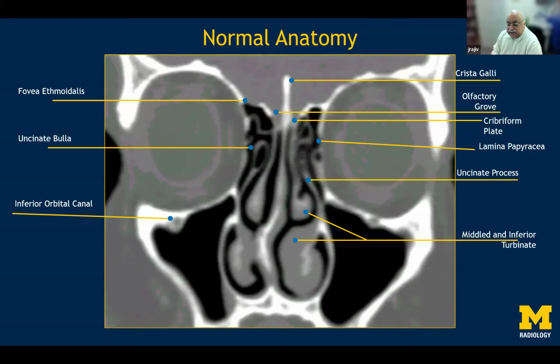So we will come to know the unscientific ways of yore, where the sinuses were actually drained by using methods related to the gravitational egress of secretions within the sinuses, which was considered to be unphysiologic. So coming back again, here again, remember this is the uncinate process, a part of the ethmoid bone, and it forms the lateral border of the egress of the maxillary sinus.